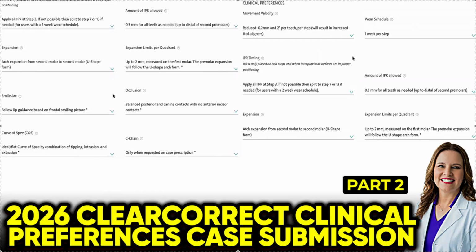All right, moving on to part 2 of 2026 ClearCorrect Clinical Preferences Case Submission. Make sure you listen to part 1 first because we went over everything up to this point. Now we're going to go over a few more things. If you're following along in your ClearCorrect portal, we are actually moving back up to clinical preferences.